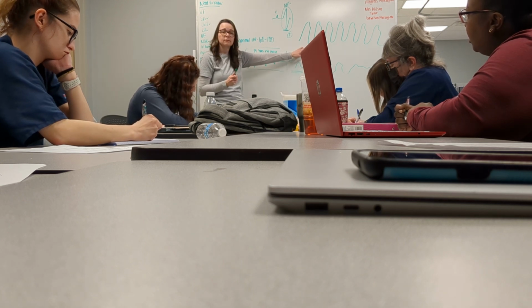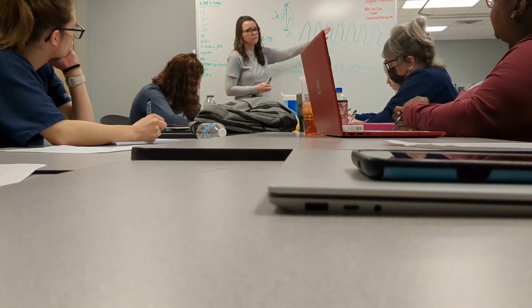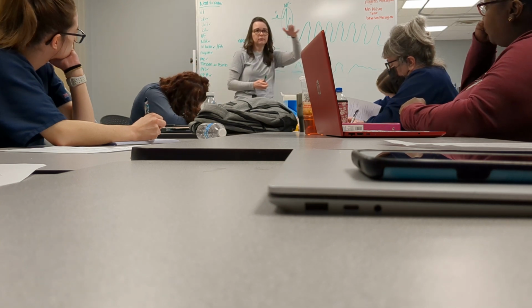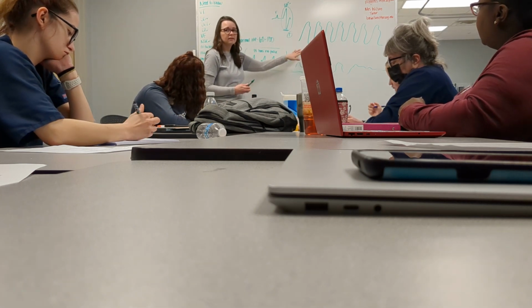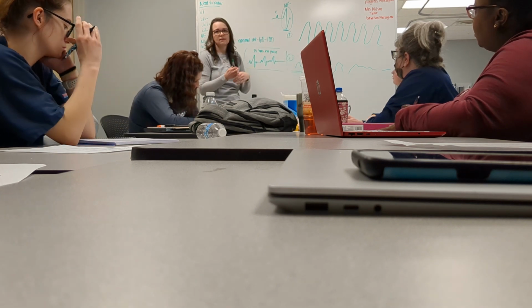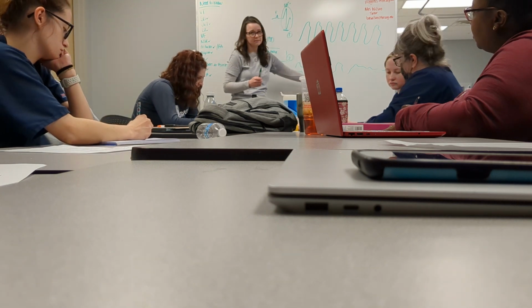This patient might have a little bit of a pulse for a minute. I've seen lots of patients have runs of this. So they'll be a normal sinus, then they'll have runs of this, like 10 beats of it, go back into normal sinus. 10 beats of this, they're an AFib maybe, 10 beats of this. Their hearts get irritated when you start doing this. It's like a sign saying their heart telling you, I'm unhappy, get a little nervous. You see this, you have a dead patient.